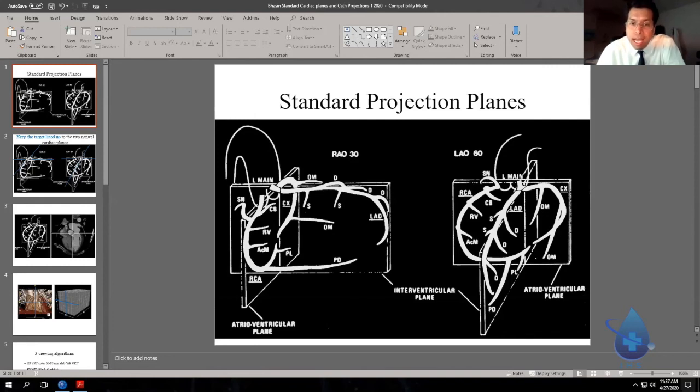And in the cath lab, we commonly look for any territories that are missing a circle of perfusion, right? One of the signs you're supposed to look for is a general area on the cath that is missing perfusion, and maybe there's a flush occlusion somewhere I'm missing.